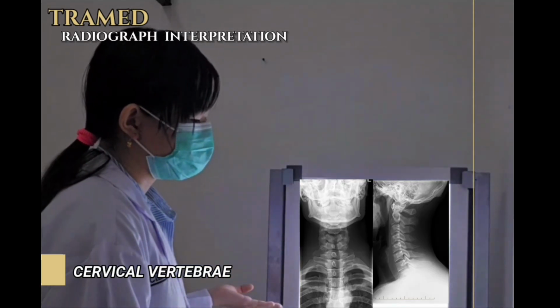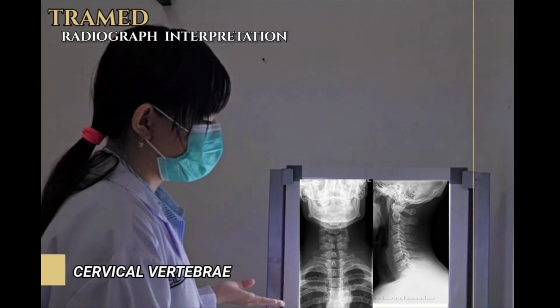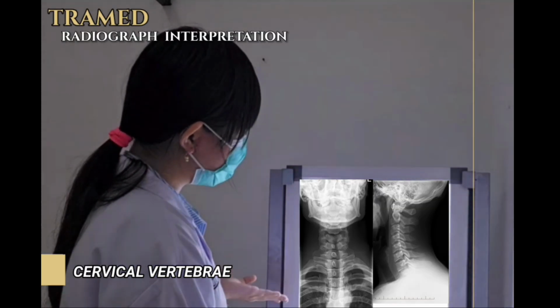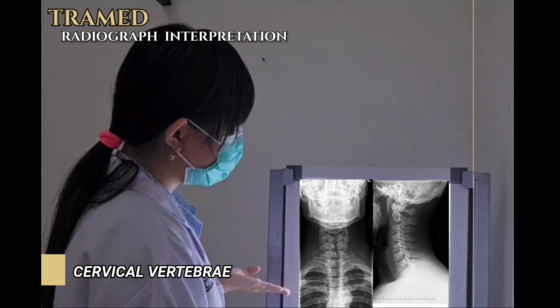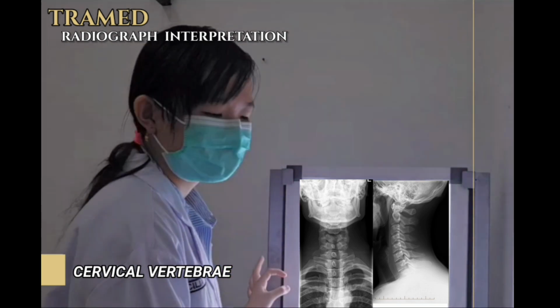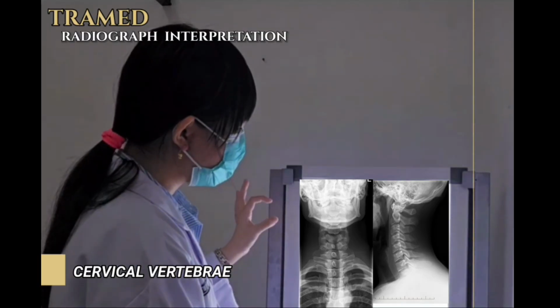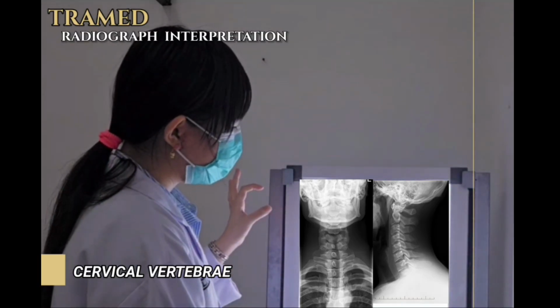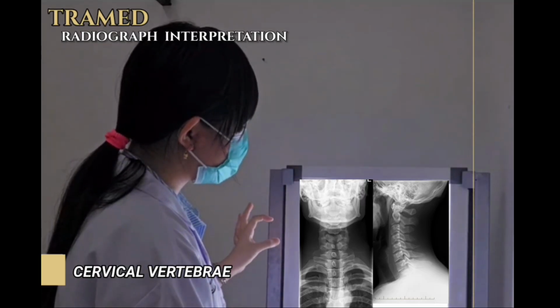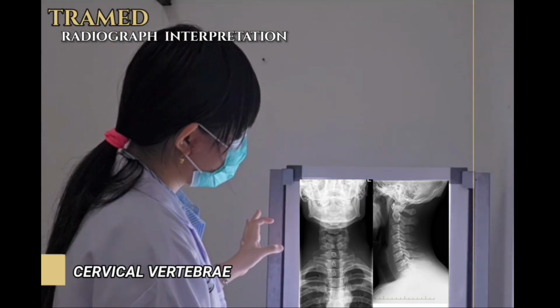And for the next, we evaluate the image adequacy of the cervical lateral. First, the adequate penetration, the visualization from C1 to C6 until C7. And the next, the vertebral bodies are superimposed, and the articular facets and cervical joints are superimposed.